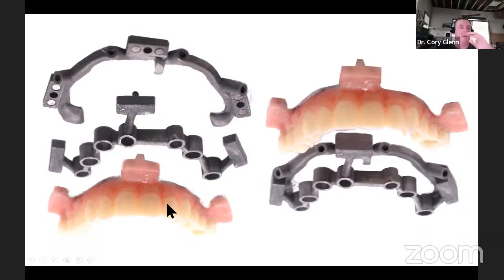And then beyond that, when you're doing things guided, you know where the implants are going to end up. And that's a huge benefit because that means I can pre-design all my prosthetics. Everyone right now is really into photogrammetry, and they'll just say, hey, wherever the implants end up, we'll take a scan real quick, and then we'll use that to build screw holes into a temp, and we'll deliver it the next day. That's great. More power to you if you like that workflow. Personally, I'd rather have it made ahead of time and just deliver my final temp that day while they're sedated, and then be done with it and never have to touch that again until it's time to restore. So, different strokes, there's not a right or wrong.